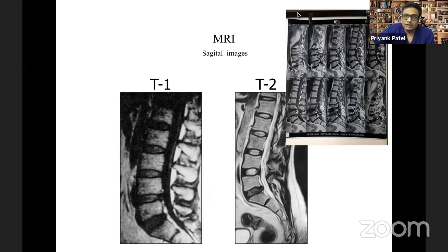So if you take this, this is how you get a sagittal film. And a sagittal film has a universal dictum, unless mentioned otherwise: it is cut from the right part of the body, going towards the center of the body, and eventually going towards the left part of the body. So you identify three special parts of this film. One is the right parasagittal, one is the left parasagittal, and the other is the mid-sagittal. When you identify these three points, then you can start studying that film. And these things are going to be standard in all MRIs.